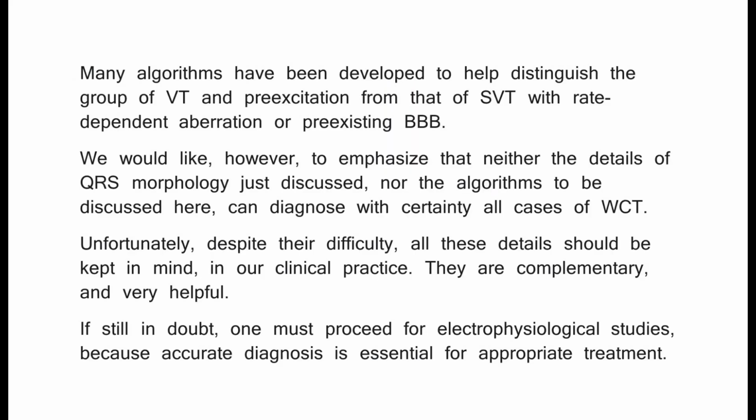Algorithms. Many algorithms have been developed to help distinguish the group of VT and pre-excitation from that of SVT with rate-dependent aberration or pre-existing BBB. We would like, however, to emphasize that neither the details of QRS morphology just discussed, nor the algorithms to be discussed here, can diagnose with certainty all cases of WCT. Unfortunately, despite their difficulty, all these details should be kept in mind in our clinical practice. They are complementary and very helpful. If still in doubt, one must proceed for electrophysiological studies, because accurate diagnosis is essential for appropriate treatment.